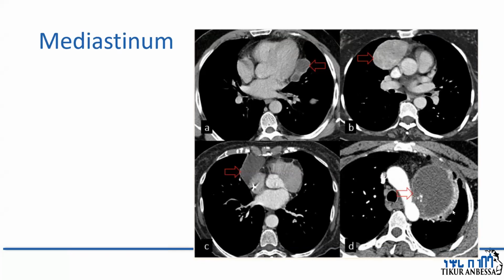Here also there is a huge mass with calcification in the para-aortic arch, which can have some ulceration to the aorta, and it has been there for a long time. You can see the fat proliferation. So this is a mediastinal hydatid.